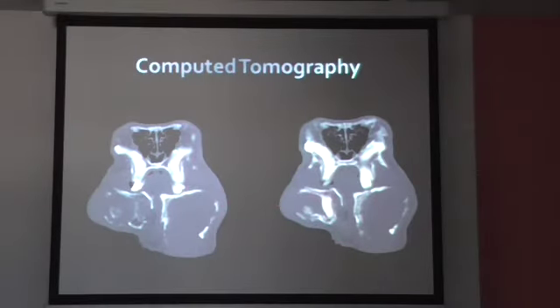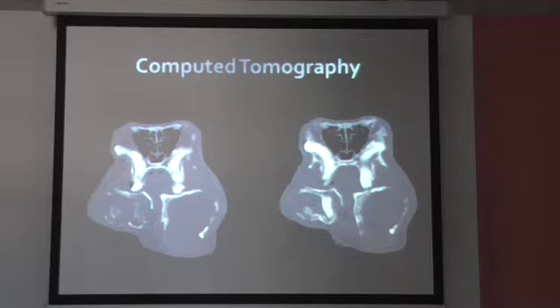Here is the last case from computed tomography; you could see huge lesions of the mandible. Obvious apical elongation of the cheek teeth: this cheek tooth is almost 2 times bigger than it should be.